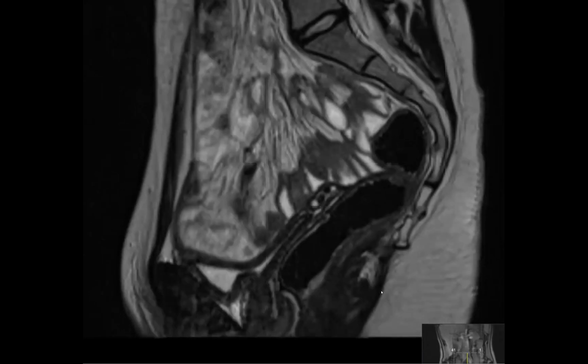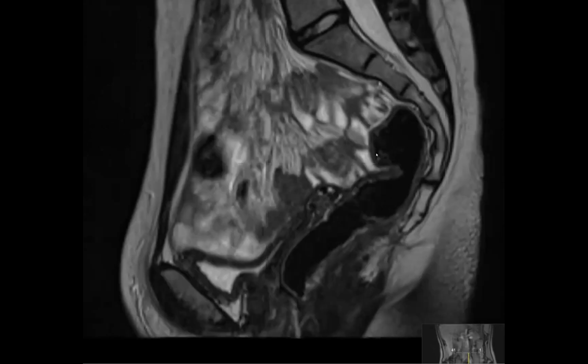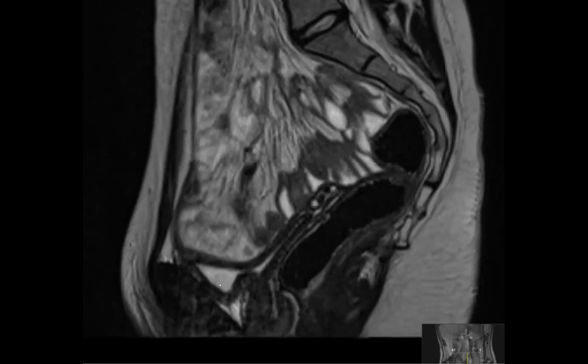So this slice, I think, has some helpful information. We've got bladder and urethra. Oh, there's no uterus. She's missing some stuff. Yes, exactly. So bladder, urethra. The female urethra is only about 4 centimeters long, and here we see it nicely. Rectal, so this is anus and rectum. And then here, this is the bottom half of the vagina. And then we don't see the top half, and we don't see a uterus.